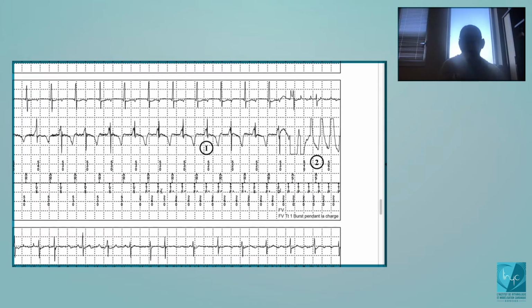It's clearly T-wave oversensing. You see here the alternance between one sharp, one smooth, one sharp, one smooth. Okay, this is classified as a VF. You see, some cycles are in the fast VT zone, some cycles are in the VF zone. Okay, at this time, the counter for the VF is full.